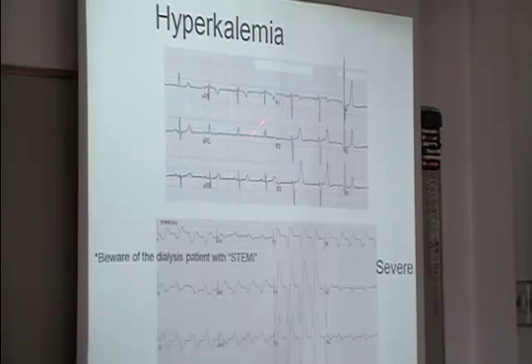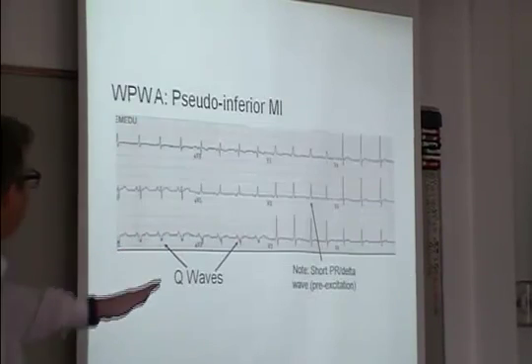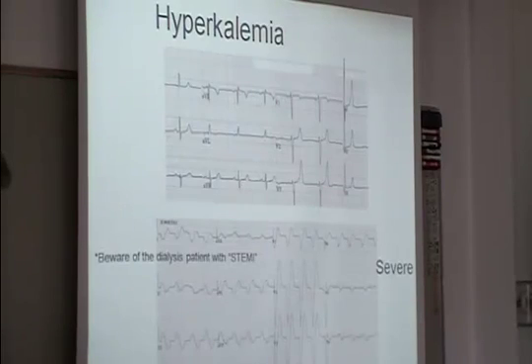Elevated potassium usually starts with these peaked, sharp T waves, like you see here, and as it gets worse, it becomes a real kind of bizarre complex. The P waves disappear, even though they're there, you can't see them, and you get QRS widening. Usually, we think about the changes with elevating potassium starting from the T wave and working backward toward the P wave. So you see the first things happening out there, and then as it gets worse, it moves toward the P wave.